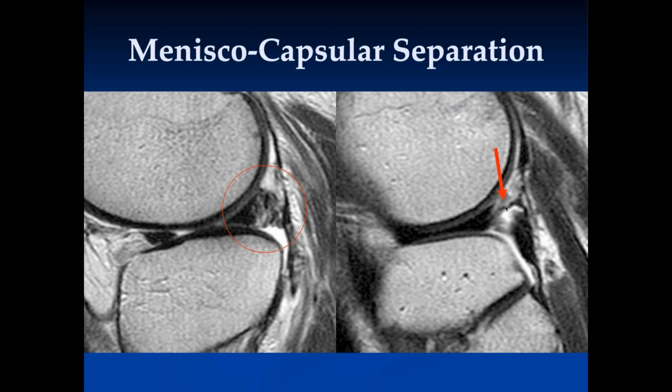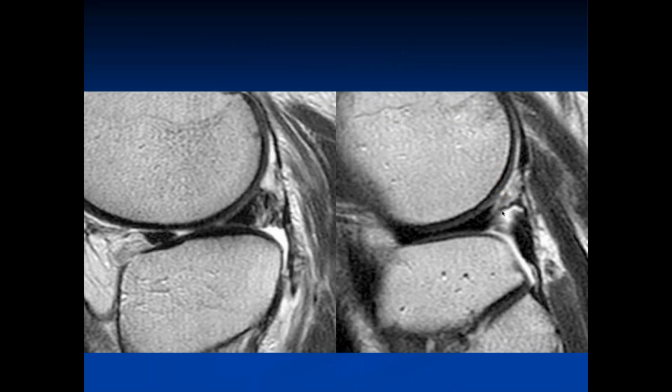No. Well, let's see. Surgically, this was another meniscocapsular separation with a tear of the superior strut. They treated this at the time of surgery. The patient was kept out of athletic activities for a while, then went back into sports and re-injured the knee. And this is what it looked like when the patient came back.